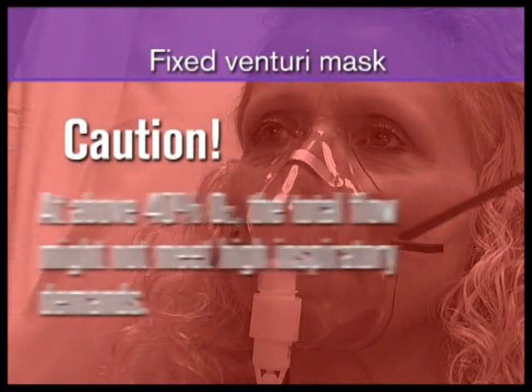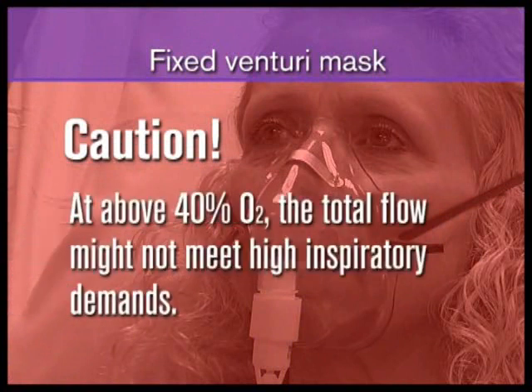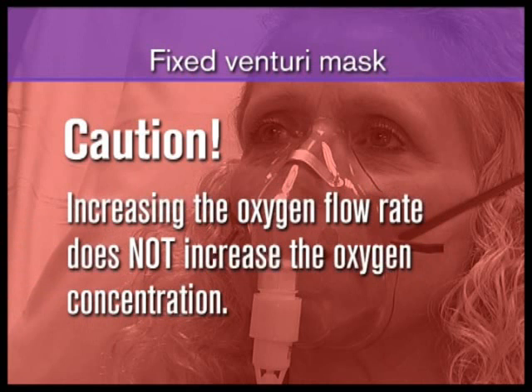Caution: at oxygen requirements above 40%, the valve may not generate enough total flow to meet high inspiratory demands. There is a widespread misconception that the oxygen concentration varies with the oxygen flow rate. If the oxygen flow rate is increased, the total flow to the patient is increased, but the concentration stays the same.